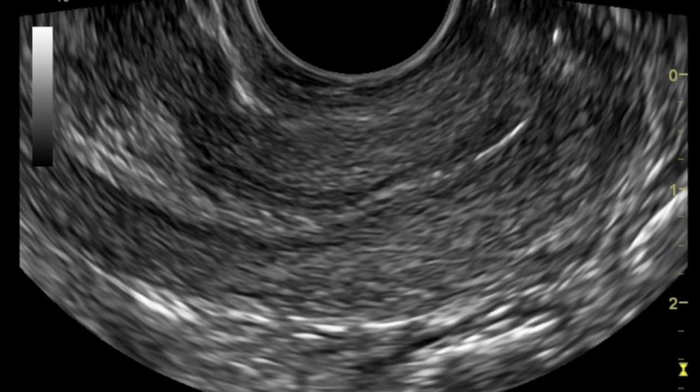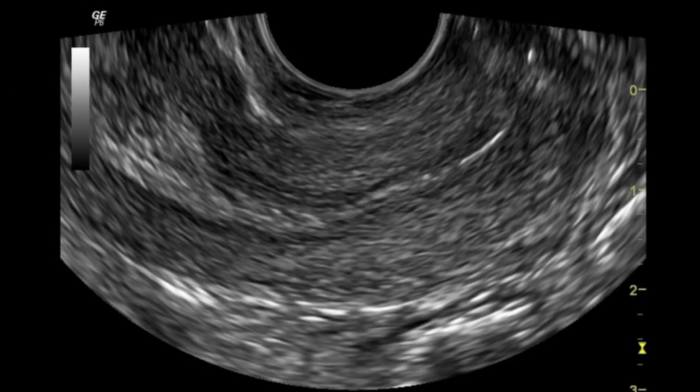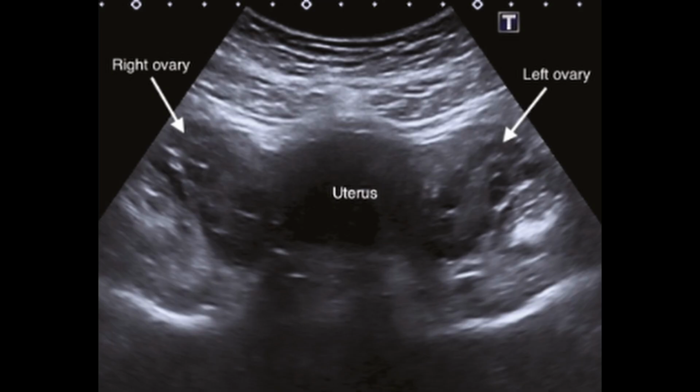Let's dive into the world of the pelvic ultrasound, where we get to peek at your insides. First up, the bladder, which, when full, should resemble a big, black, liquidy balloon. The kind you wish you could fly away with, but it's filled with something else. If we see some weird lumps or the walls look thick, it's like the bladder is trying to tell us a story, and it's not usually a comedy. Next, the uterus, which should have a smooth, pear-shaped vibe.